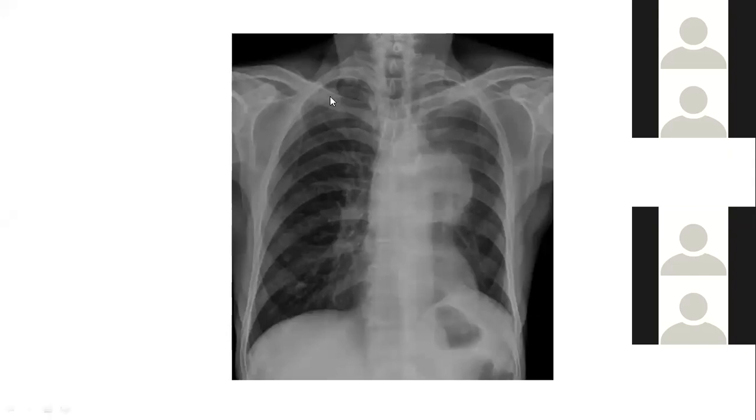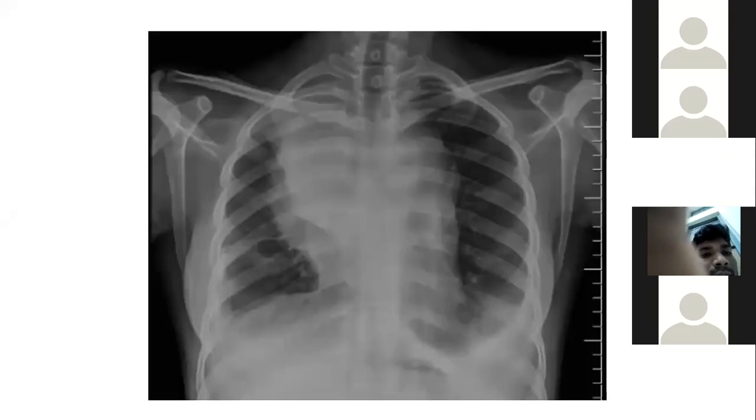Okay, and most of the time, especially in this one, can we try to find where the lesion is located, which mediastinum? Based on the findings here, anterior mediastinum, one of you is suggesting. Okay, anterior mediastinum. So the majority of you feel it is from the anterior mediastinum.